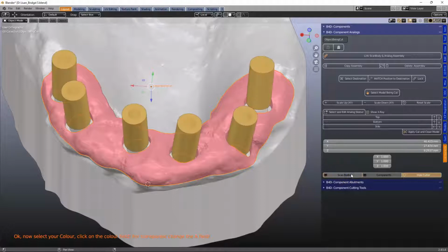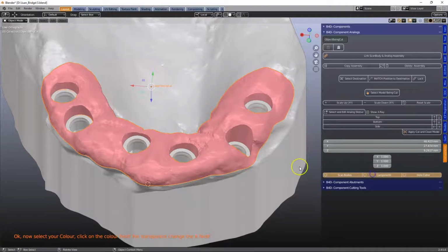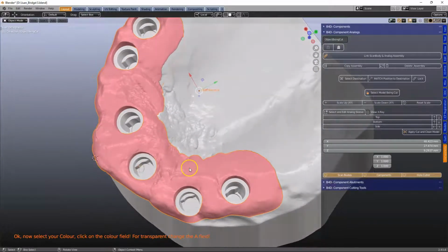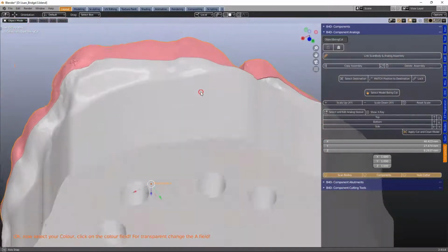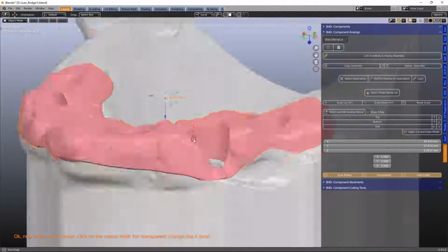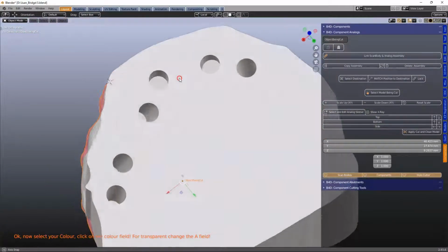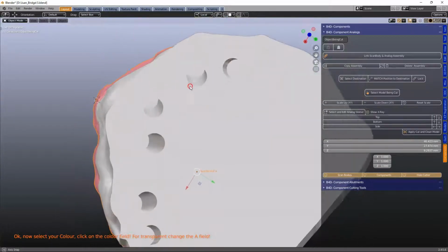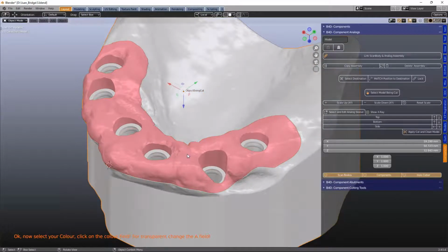Now there's just one more thing I'd like to mention, and that is you may be wondering why the holes don't go all the way through, and this is because these capsules holding these have not been designed in this way, but in some of the actual implant analogs, they have been. So if you wanted to puncture a hole through there, that's quite easy to do.